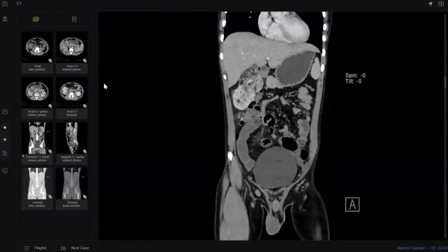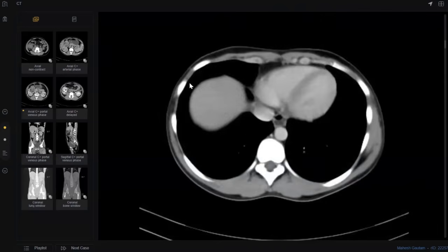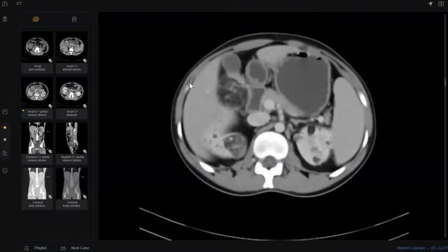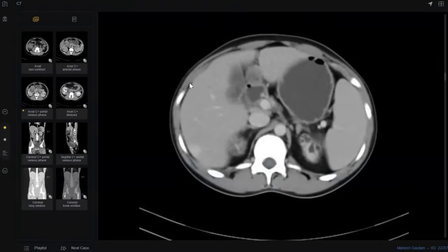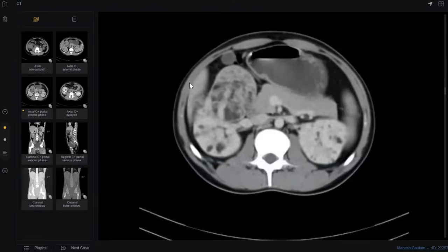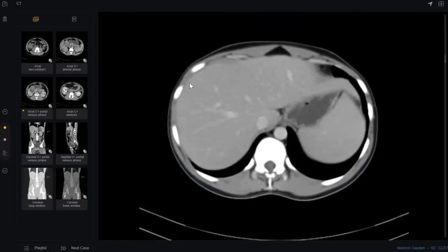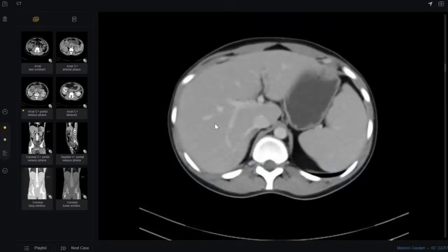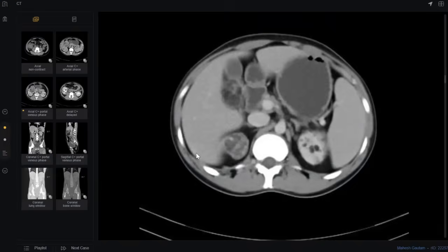This case was very nice. The patient has very obvious and very common pathology: bilateral angiomyolipoma. Number one, you must rule out any associated mass, angiomyolipomas or cysts in the liver, like this one. Okay, or this one. It was this one, a hemangioma.